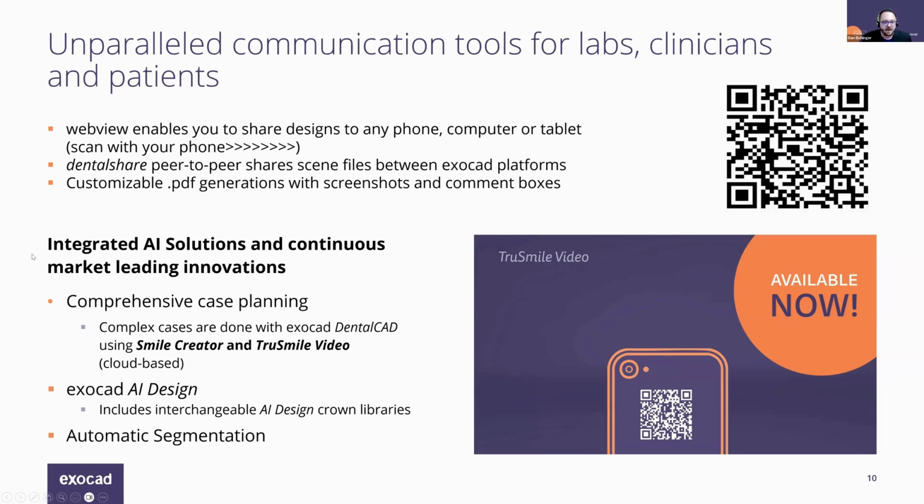As I was talking about earlier with integrated AI solutions, when it comes to case planning, when you're working on treatment plans for a patient, with Smile Creator and True Smile Photo and True Smile Video, the software is going to allow you to add patient photos as normal with Smile Creator, but in the 3.2 feature release, the software is actually going to automatically align the model to the patient photos.